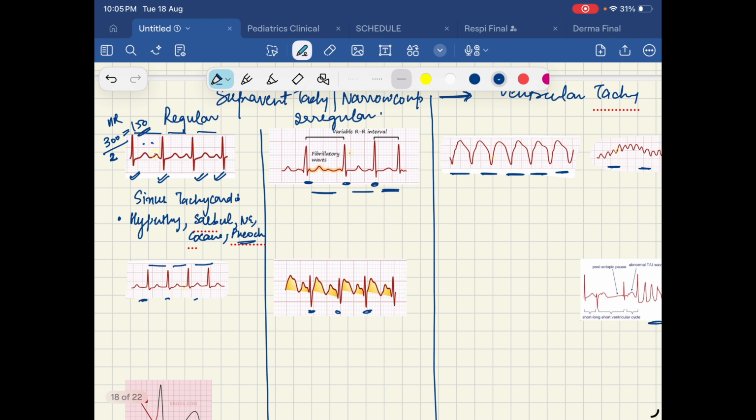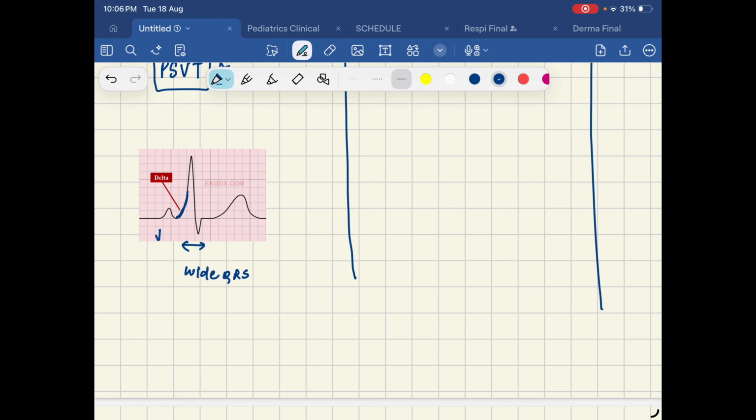Can you see that there is something weird with this? This is the PR interval and the QRS. QRS is a little widened and the PR interval is a little shortened. And you can see a typical delta sign. This is a special case scenario in ECGs. So decreased PR interval, widened QRS, and a delta wave, definitely delta wave, these are all characteristic of WPW syndrome, right? This is very important, and later on we'll be discussing the treatments of each ECG.